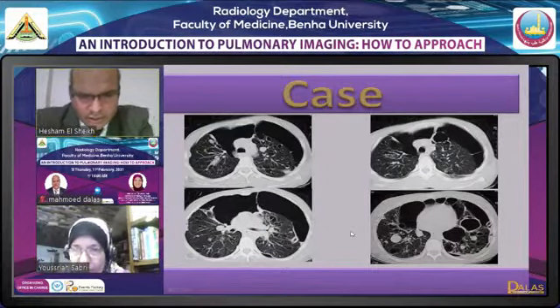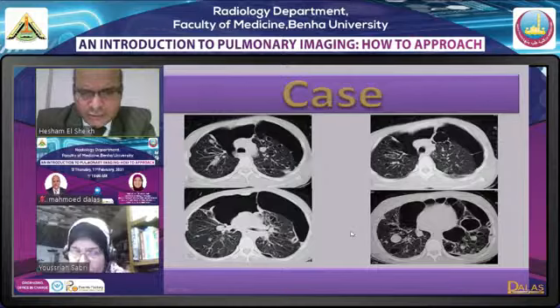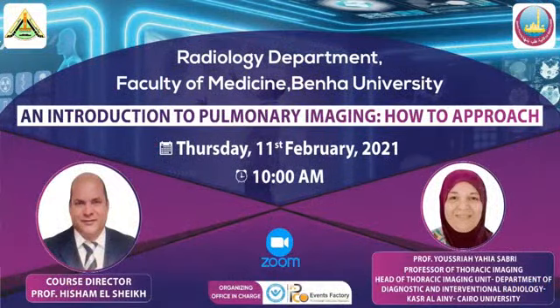Another, I think this is an easy question. How can identify a central mass in totally collapsed lung? طيب بالسي تي ولا بلين اكس راي؟ بالبلين اكس راي مش هشوف. يعني الا بقى لو واحد مكشوف عنه الحجاب وبينه وبين ربنا عمار وحاسس بقلبه ان في ليجن جوه. بالستي بمنتهى البساطه الماس ده هيبقى ديماركيتد من اللي حواليه، يعني هو هيبان لوحده كده، هيبقى ديماركيتد من اللي حواليه ان في جوه الوسعايه دي في انذر ليجن.